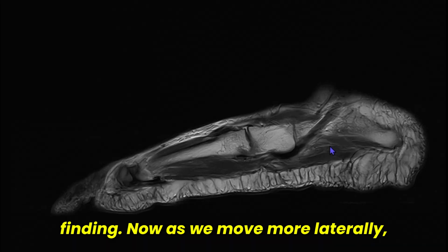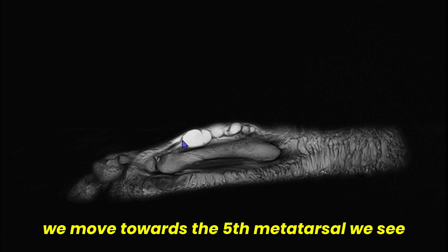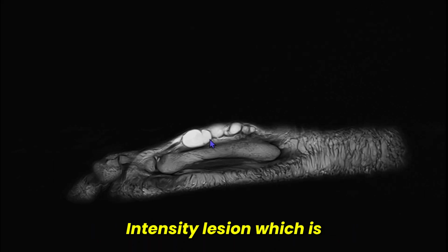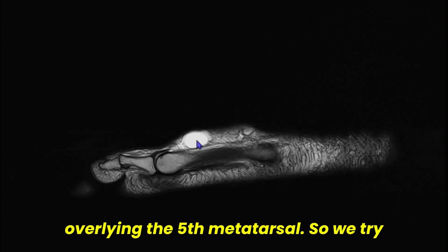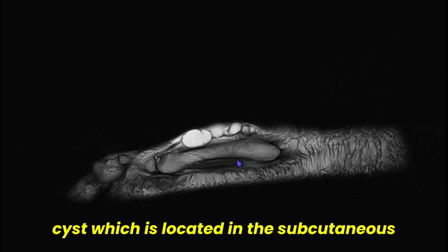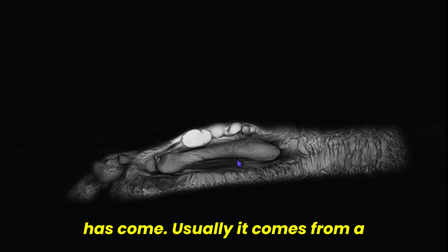Now as we move more laterally, this is the fourth metatarsal, and now if we move towards the fifth metatarsal, we see that there is a lobulated similar signal intensity lesion which is intercommunicating and has septations and is giving a beaded appearance overlying the fifth metatarsal. So we try and see if we find a ganglion cyst which is located in the subcutaneous plane on the dorsal aspect. We try and see first from where it has come.